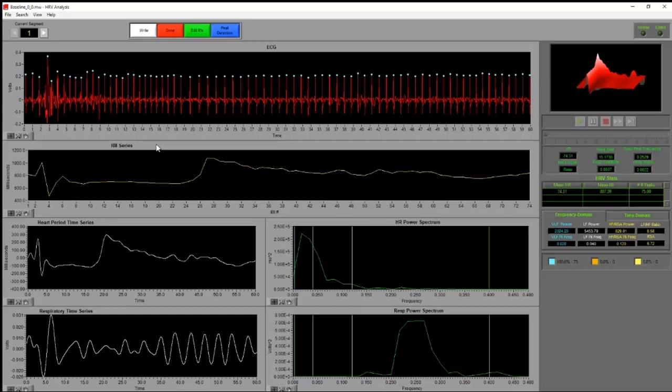And this is pretty ubiquitous throughout most of the literature with looking at human ECG data, is that in most cases, we have a minimum of about 30 seconds of uninterrupted continuous data. Most groups will expand this up to a 60-second interval, which is what we're doing here, if you look at the time series, because then we have a lot more freedom in how we edit the data. Let's say that this information we see at 3 seconds is too messy. We really don't want to estimate where the beats are. Then what we could do is we could simply start at 4 seconds, use all the information up to 60, and we still have way more than 30 seconds, and we've collected a lot more of that high-frequency data.